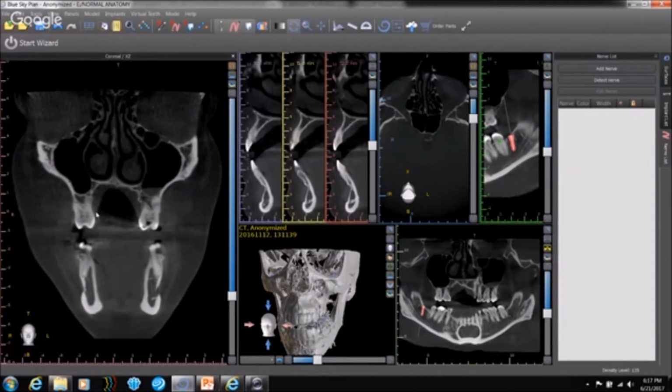I do understand that most of you may not be using a large field of view for the sake of implants. That is perfectly fine. I use this for the sake of completeness, so that I don't have to switch between different scans as such. So when you have them actually scanned, you're able to see the sinuses, which appear typically black.